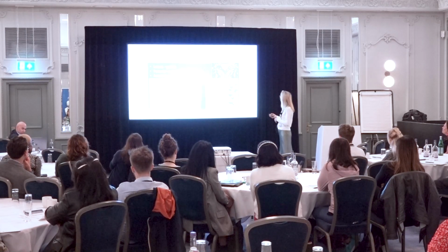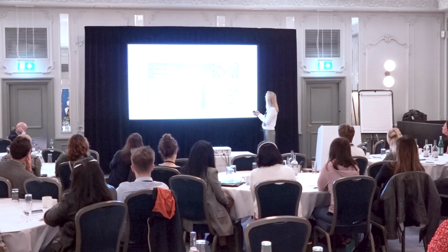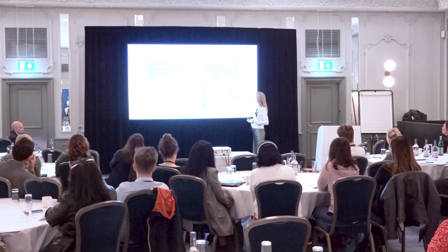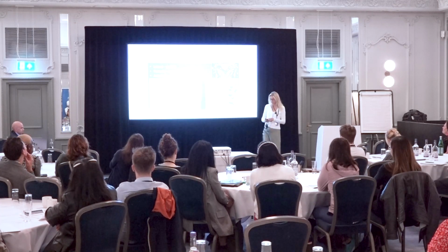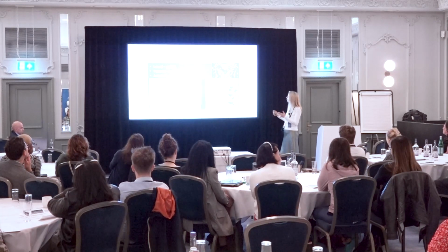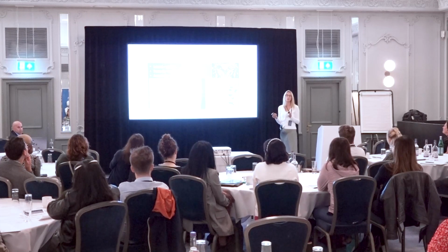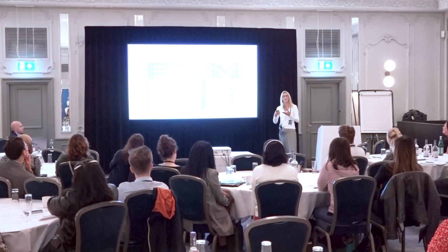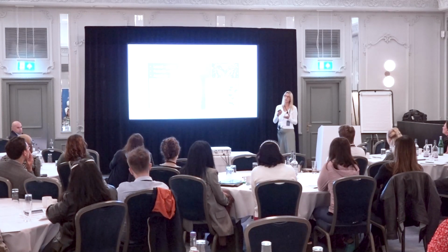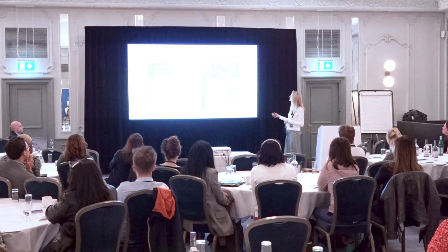And so you can see here, you get nice wide open space. Here it gets narrower and more narrow and more narrow. So you always have to look laterally in the spinal canal. You can get some patients who on a sagittal view have a nice capacious spine, but when you look axially, you see that laterally they're quite stenotic. So it's always important to look at both aspects.